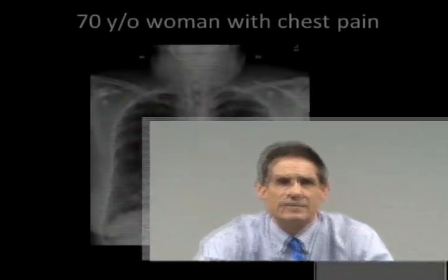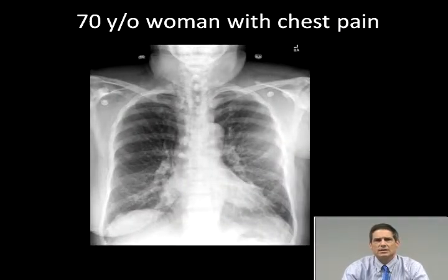The other issue is that frequently ribs will fracture at the costochondral junction, and those will just flat be invisible, pretty much, even on a CT or x-ray or whatever you want to do to try to find those things. So basically, it is more important to know that they've got a pneumothorax or hemothorax than that they have a rib fracture. But it's always good to make a diagnosis. Okay, 70-year-old woman with chest pain, a chest x-ray.